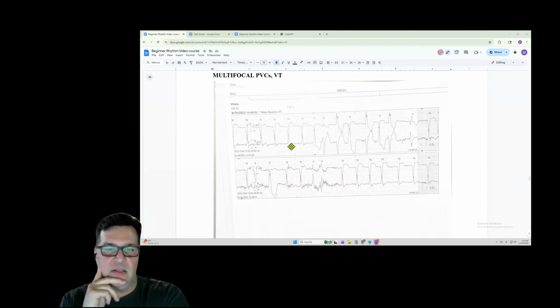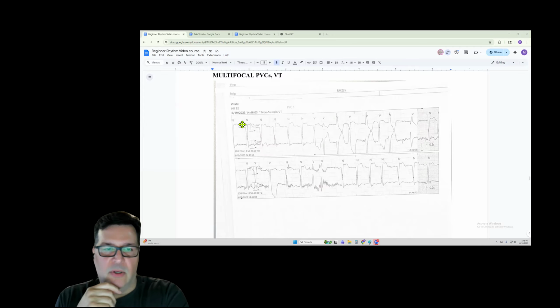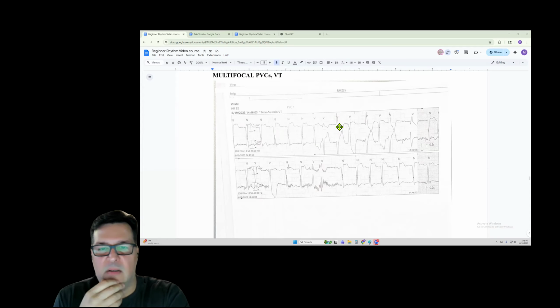So you have sinus. In my mind, it means the same thing, and it does. You have a wide early beat here, and when you're looking at your QRS complex, you're looking at the V lead. This is probably a fusion beat in the middle. But you see how nice and big and wide this one is compared to over here, and it goes positive, it changes deflections.